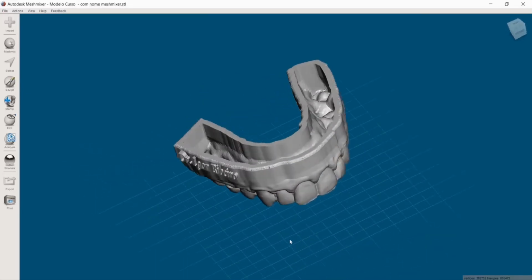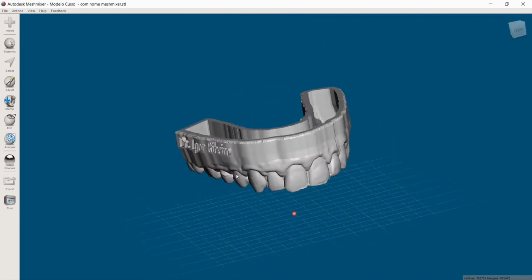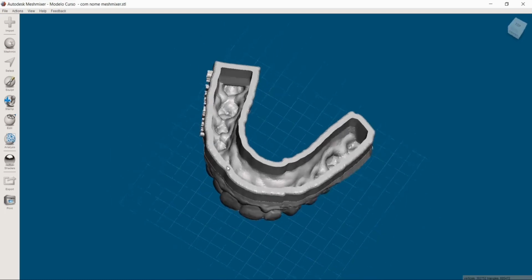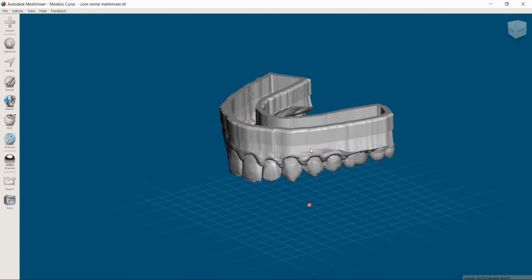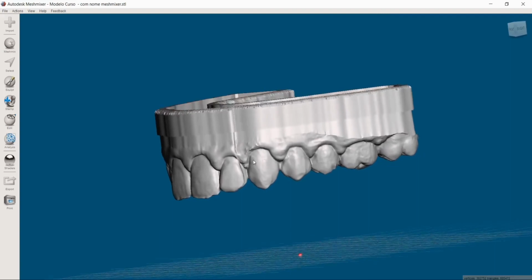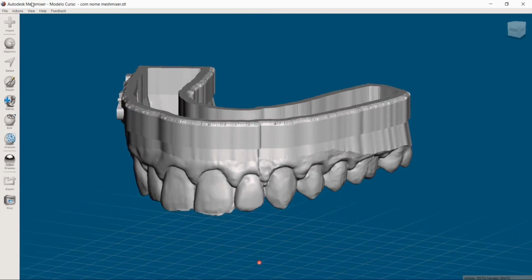This is a continuation module. After you've made this print template with the name and everything else you're going to need to print, I don't know if most of those who are taking the course have their own 3D printer. Each 3D printer has a different software. However, there's a hack in MeshMix that can make it easier to place it in the printer software. I'm going to show you here.